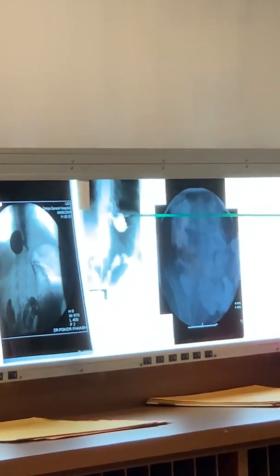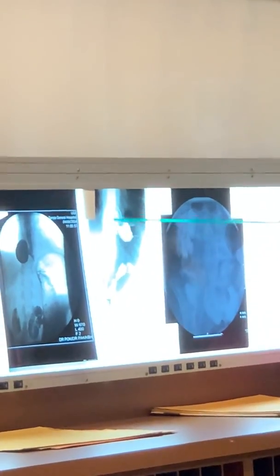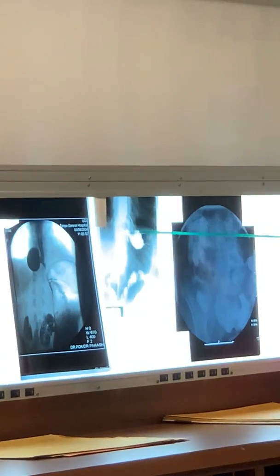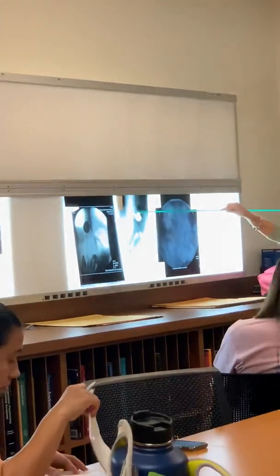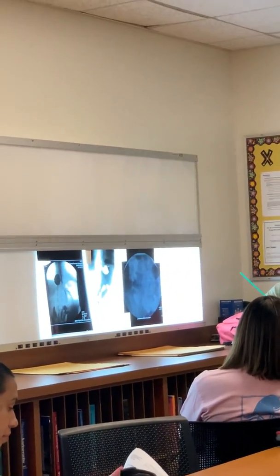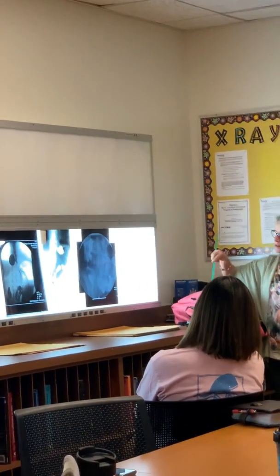This is a hiatal hernia. So this is where the fundus of the stomach just pushed up underneath the esophageal hiatus. So it's up above the hole. See how the whole fundus is gone? That's a big one.